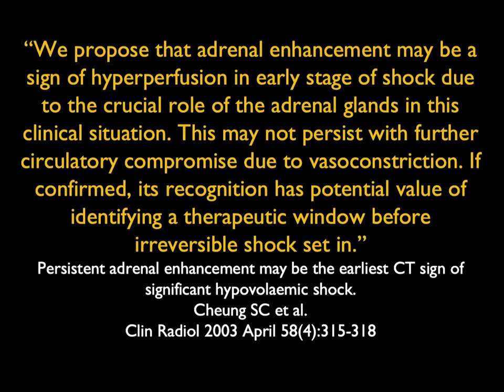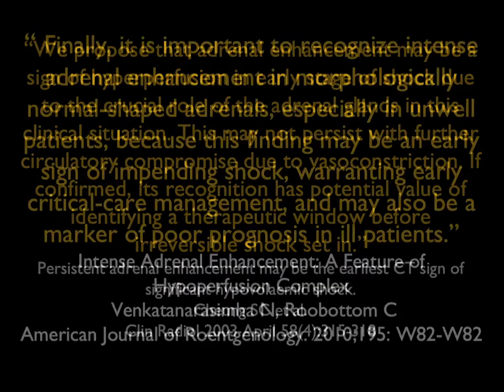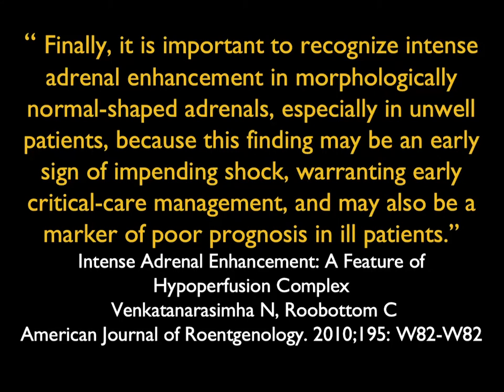This article by Chung: we propose that adrenal enhancement may be due to hyperperfusion in the early state of shock, due to the crucial role that the adrenals play. Another article from AJR: it is important to recognize intense adrenal enhancement in normal-shaped adrenals, especially in unwell patients, because this may be an early sign of impending shock. So again, a very important finding.